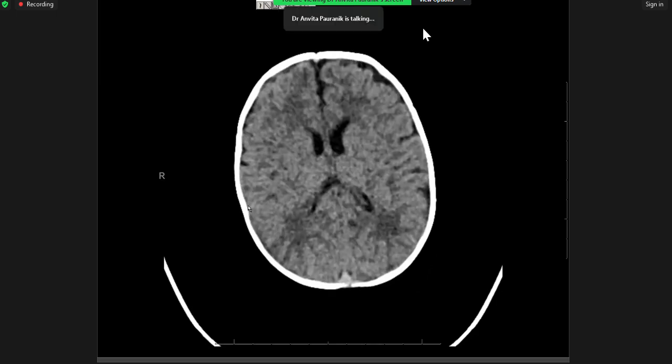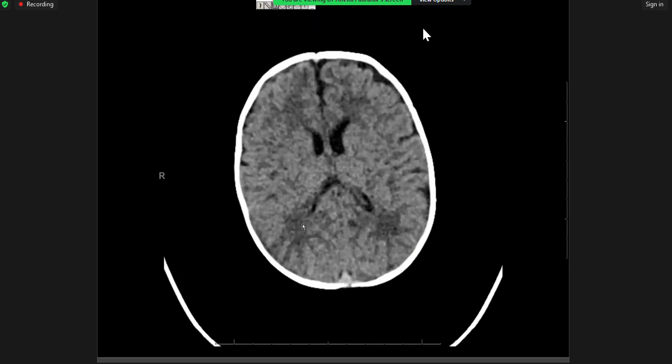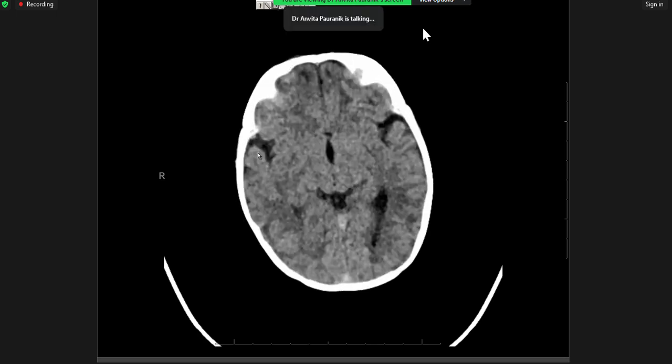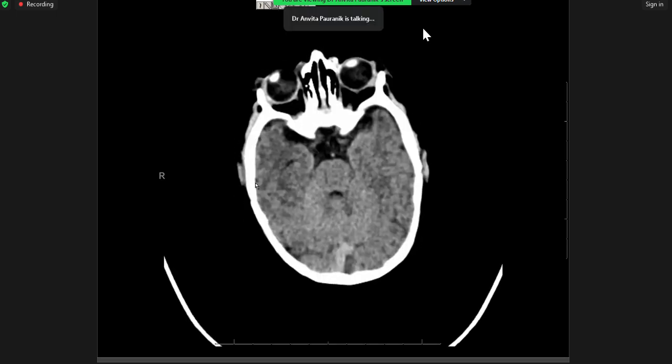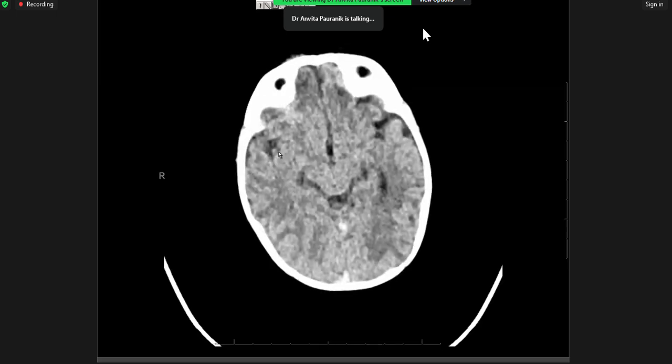Hmm. Compare material attenuations. Okay, that's fine. Yes, you can put ROIs and see how high it is. And yes, arterial. That's also what Ashwini has mentioned. That's really important. So sometimes when you have overall high hematocrit or dehydration leading to just apparent high density of the sinuses, it can be a good idea to look at the arterial side. This is not exactly showing up nicely on this image, but for example, the basilar artery density, and let's say one of the MCAs, sometimes it can be useful if they are also comparatively higher.